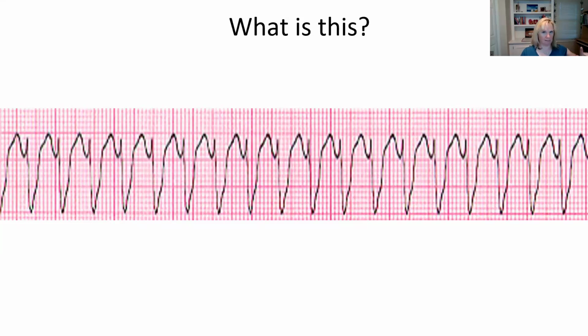You're right. And some people will go as far to say it's a wide complex tachycardia, right? Because it's a wide QRS. It could be something else, right? It could be SVT with aberrancy potentially, but it's more likely that it's actually ventricular tachycardia. If you have fast, wide, and regular, there's at least an 85% chance that it's going to be VTAC.